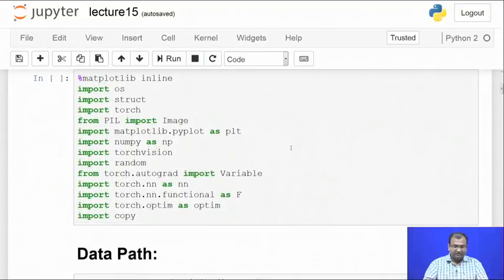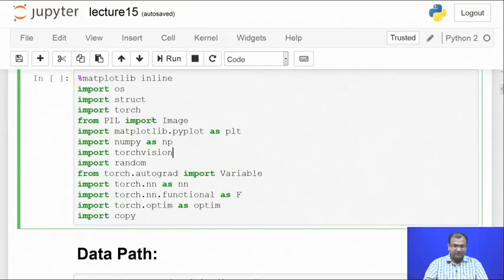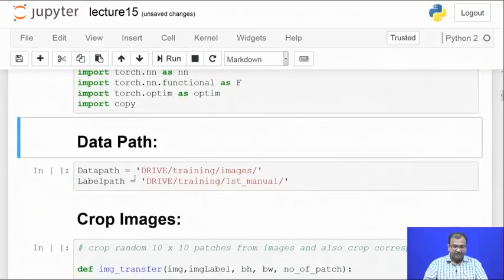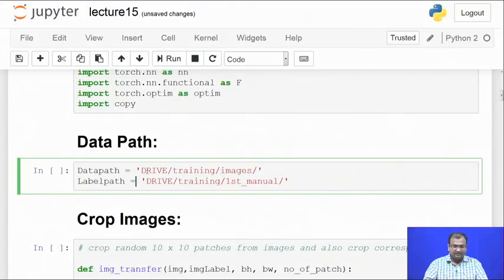Now, as with any of our earlier ones, you have your standard header where you are just going to import all the libraries and keep them ready. So, you just need to run this part, and that is ready. Now, on my data set, when you download the whole folder, everything comes down as a zip folder. If you unzip it, you will see this kind of a directory structure.